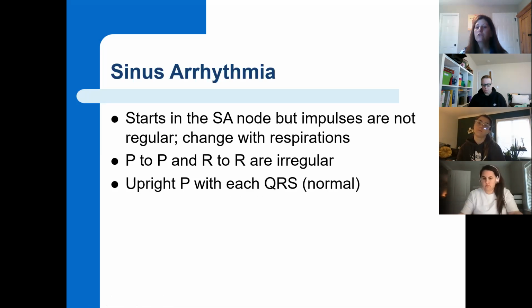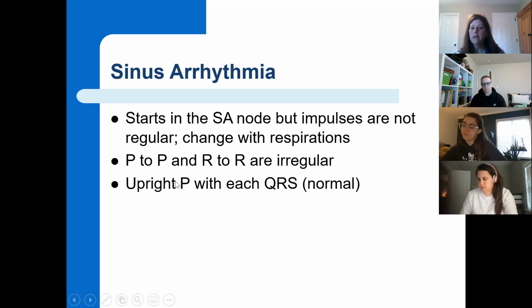All right. Now, yesterday when we very first started, I talked about arrhythmia and dysrhythmia, and I said a lot of times you're going to hear those used interchangeably. But really, dysrhythmia means that there's something not normal, and arrhythmia really means that there's just an absence or a pause. And so we're going to take a peek real quick here at sinus arrhythmia. So it starts in the SA node, but the impulses are not regular. Your P to P and your R to R are not going to be regular. However, your P wave still should be nice and round and upright, and your QRS should look normal, okay? But we're just definitely going to see a pause.